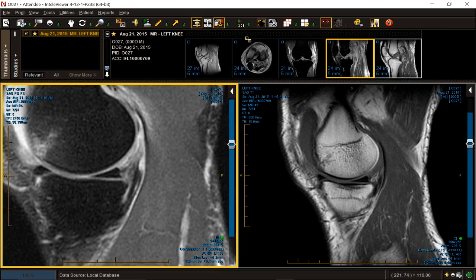So once again, let's go to the conclusion. Conclusion. Hyperextension dislocation injury with meniscal sparing involving the following. 1, ACL rupture. 2, PCL rupture. 3, posteromedial corner injury involving the OPL and meniscocapsular attachment. Number 4, posterolateral corner injury rupturing the meniscofascicular attachments. A, B, popliteus tendon. C, posterolateral capsule. D, fibular collateral ligament, and so on down the line. And that would be my conclusion.